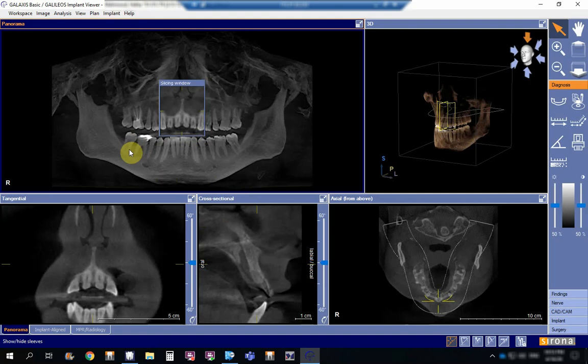once it is processed in the computer, the main window, as we said, this is Windows operated, so the main default window will open in five windows. The default one is the Panorama, as you see in here, and there is the 3D.